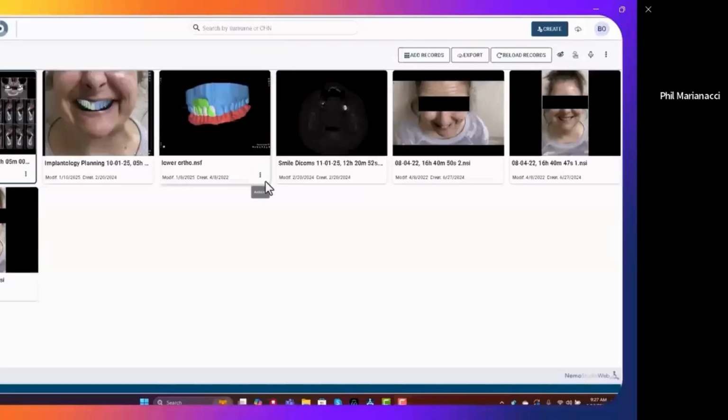So we're going to have a look at some of the features within the Nemo environment. Nemo is set up so that when you open up the user interface, you'll create an instance for a patient, and within that desktop view, you can have images that are two-dimensional, other three-dimensional renderings, whether a CBCT, DICOM, or STL files from an intraoral scanner. PDF files are also supported, so these things can all be archived within the user interface, and they can be built along a specific timeline.